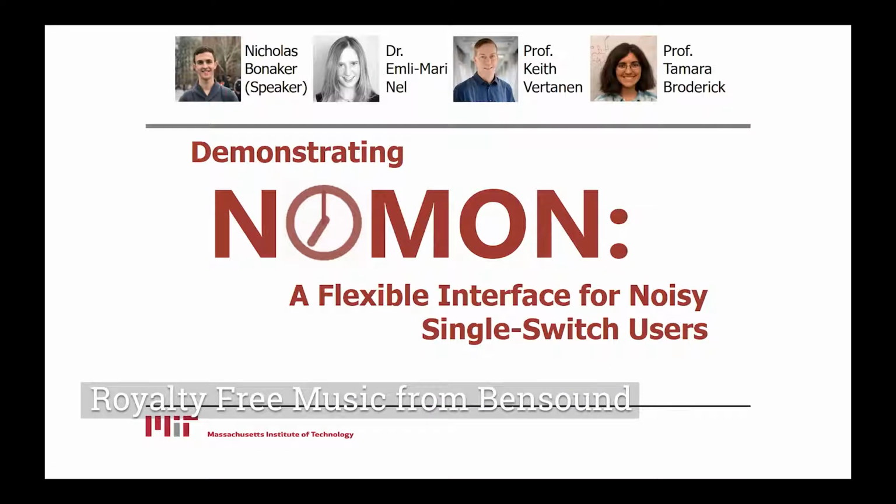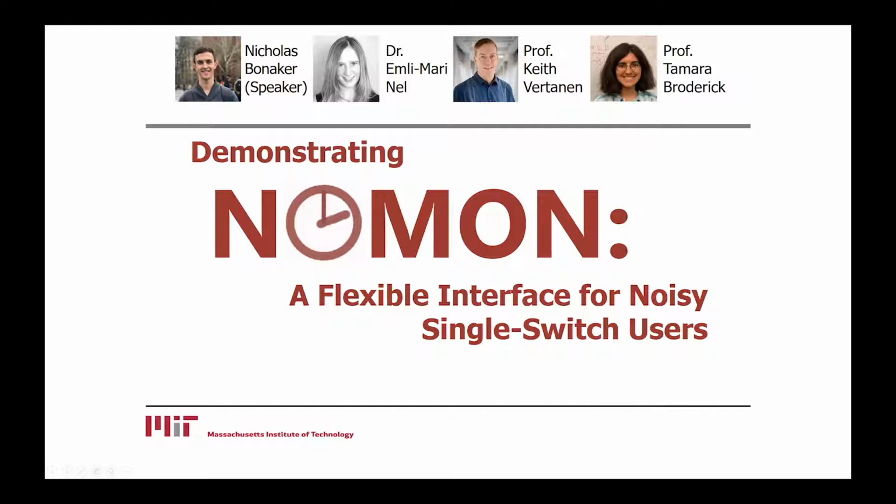Individuals with severe motor impairments, such as cerebral palsy or locked-in syndrome, often communicate using a single switch. Users may control the activation time of their switch by pressing a button, releasing a puff of air, blinking, or some other motion. Special applications then take these switch inputs and allow users to communicate or control their computer. Our software, Nomon, is an interface designed to facilitate fast and flexible selection with a single switch.